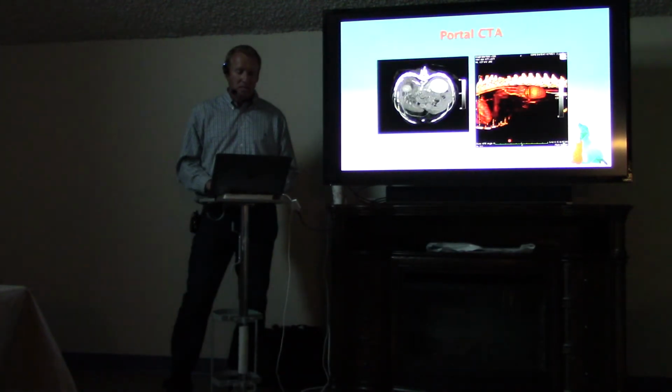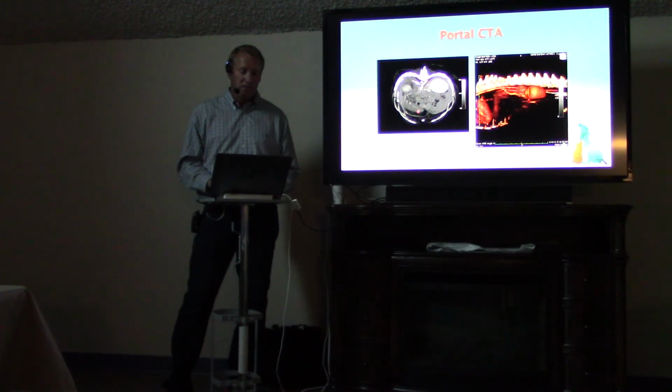And so we did do a CT exam, and it's a very easy diagnosis to make here. There's a large tortuous vessel connecting the portal vein right here up to the azygous vein here. So this is a portoazygous shunt. We can see it on the volume rendering image here as this blood vessel right here traveling up dorsal to the liver to the azygous vein.